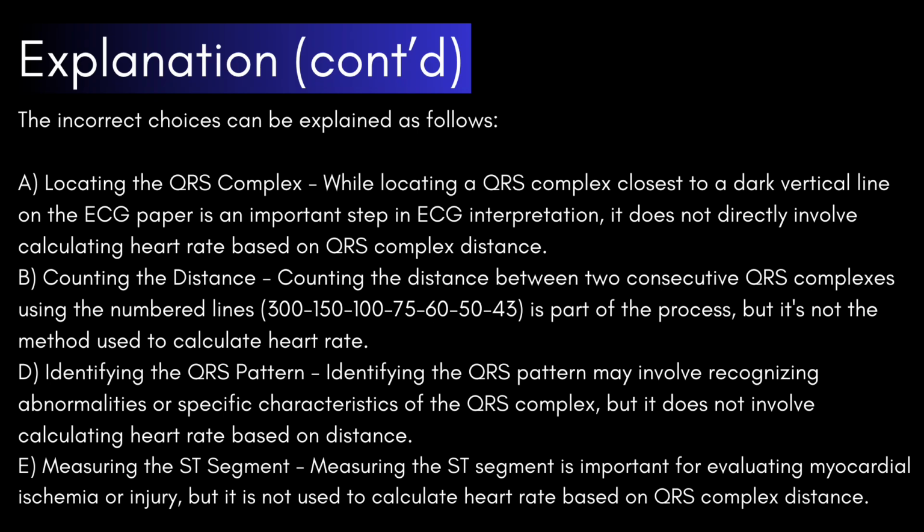E, measuring the ST segment. Measuring the ST segment is important for evaluating myocardial ischemia or injury, but it is not used to calculate heart rate based on QRS complex distance.